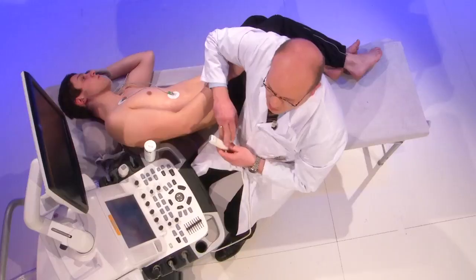We have two methods to do so, tissue Doppler imaging and speckle tracking. And I would like to guide you through these two methods and show you some details of data acquisition for these methods. The most important thing, since we are talking about quantitative function, is that we have good images, good image loops, and we need several image loops to evaluate the function of the ventricle.